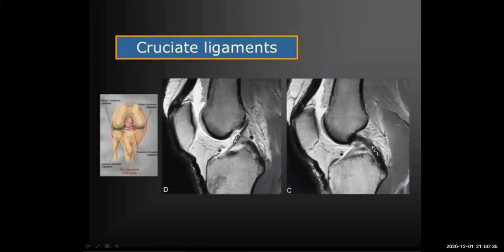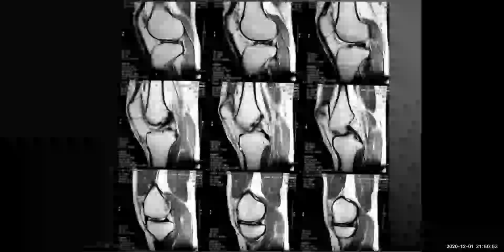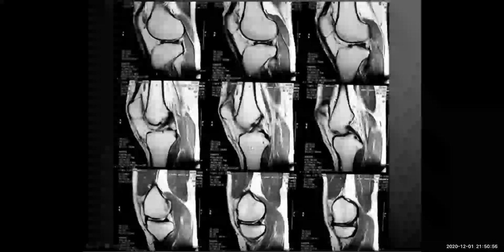Then you can ask your patient to come back for doing an MRI. So then, if it is white, you can say together with the clinical examination, it's solved, or you can say this is a partial tear if it is like a normal finding. Okay. So this is an MRI. Let us just say this came together, how we can approach it.